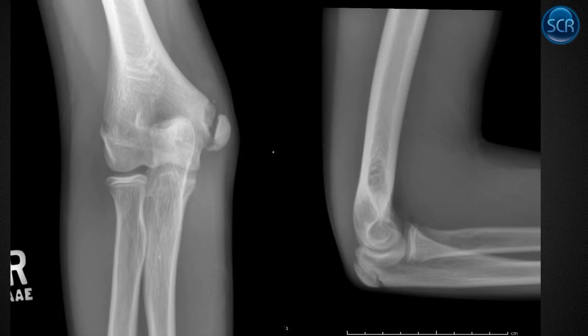Here's an example of a little leaguer's elbow. They're doing some chronic repetitive thing that puts tension on their wrist flexors, and they've avulsed off their medial epicondyle. Okay, so this physeal plate is way too wide. It should be a nice thin line with two parallel surfaces, not this kind of asymmetric widening with distraction. So this is a little leaguer's elbow.